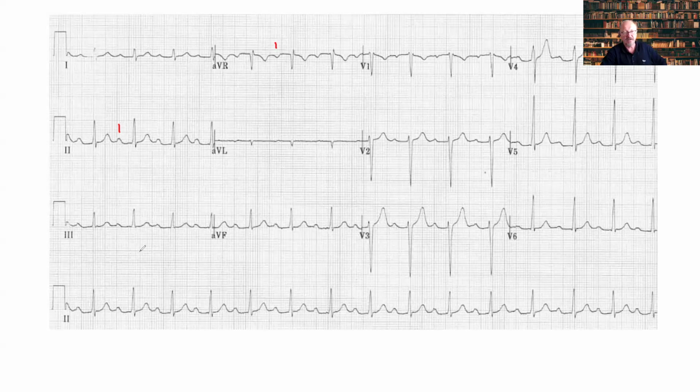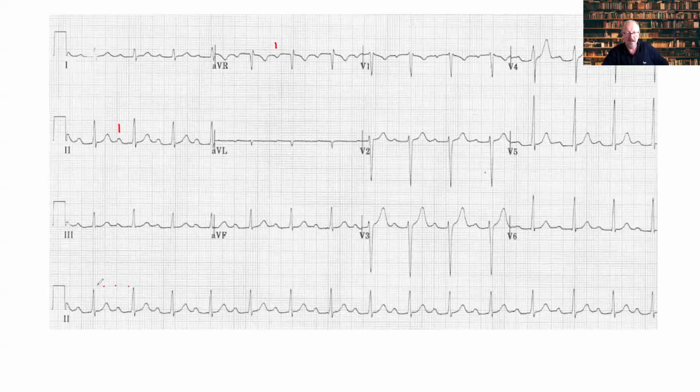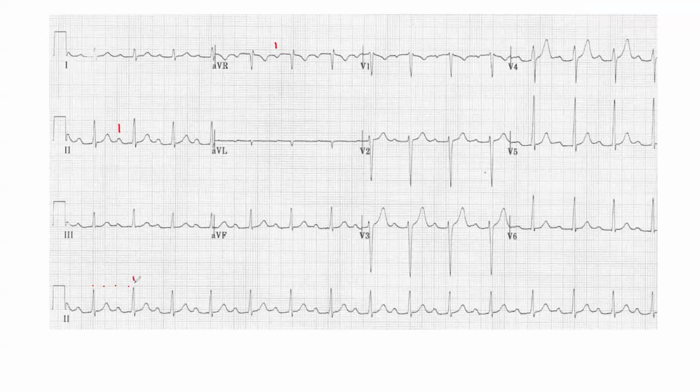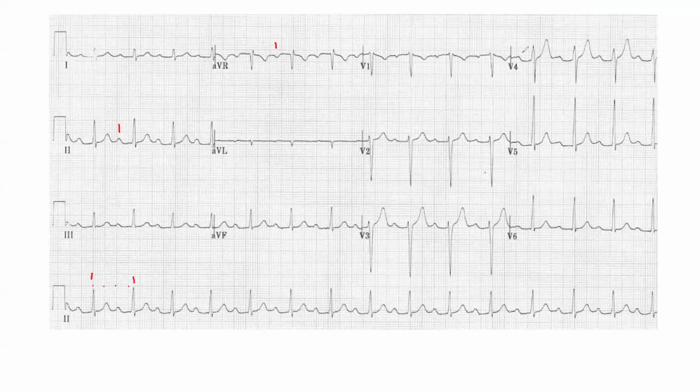Rate, heart rate. For the heart rate, I will look at the RR intervals, and it's a little bit less than 4 squares, about 3.5. So 1 second. It's like a heart rate of 85, 86. That's okay, so it's a normal one.